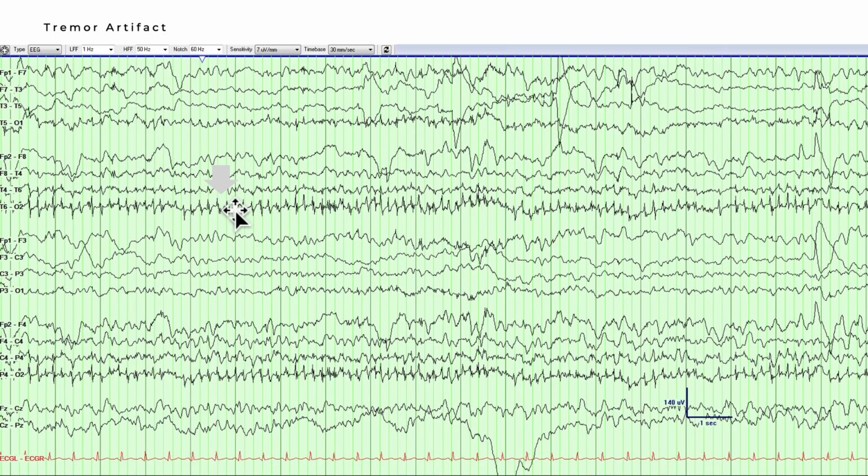So this is a tremor artifact, and you see these little myogenic blips. They look sort of spiky. This is how EMG tremor artifact can sometimes look with the related muscle involvement. And so this is something to be aware of. And look how it's the same frequency again and again. It's in the posterior region of the head. And this is someone again with a head tremor, actually.